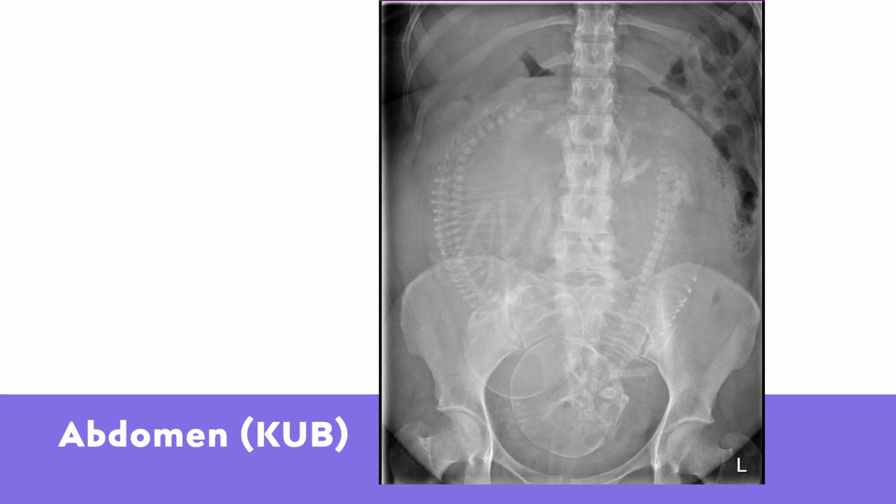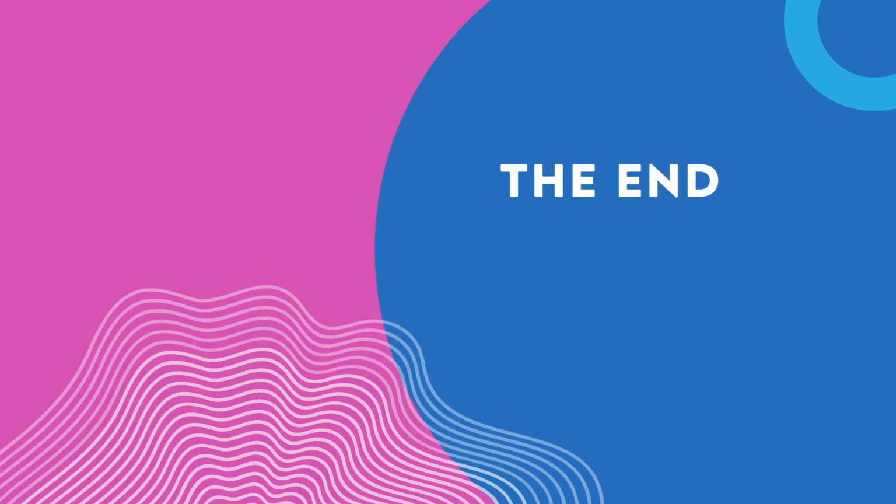This doesn't happen very often because we usually don't x-ray our pregnant patients, so this was a really cool opportunity ordered by the radiologist. Malrotation of the intestine is uncommon and normally found in infants, but occasionally adults. Rare symptoms of malrotation may occur during pregnancy. So obviously this was the issue here. The end.